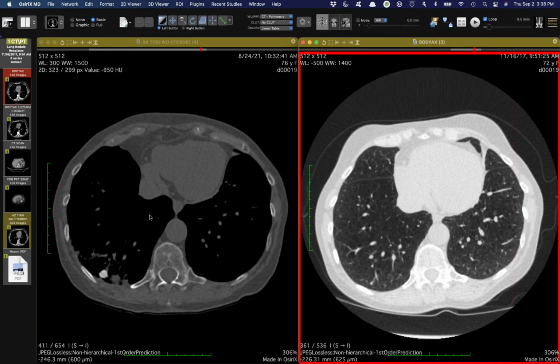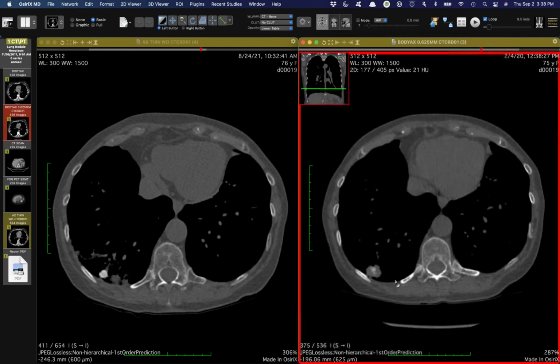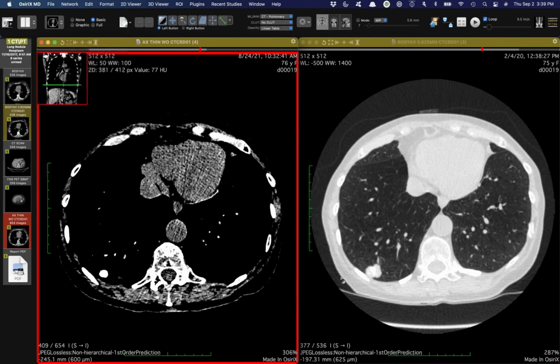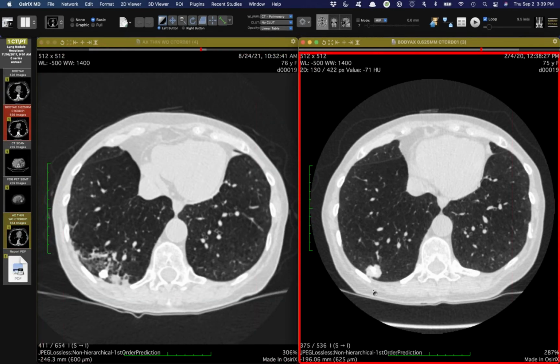That's a tough one. It had enough unusual things. I probably would have followed it. I don't think I would have jumped on a biopsy. If it were small cell, it should declare itself rather quickly. But I wonder if it was a collision lesion because small cells grow so fast, I don't think they have time to calcify. Well, who knows? The fact that we had the prior from just over 2 years before, and there was nothing there calcified, you would have had to have had a quick granulomatous infection and then calcify. So I don't know.